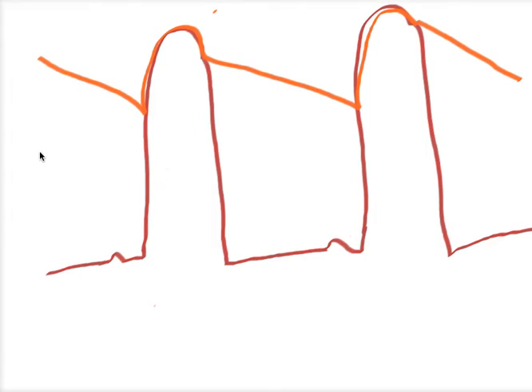This is Dr. Demarchena, again with Aaron Cohen, and we're continuing our discussion of aortic stenosis. In the previous video, we looked at the normal pressure tracings. Let's remember that S1 occurs about right here, and S2 occurs right at the aortic valve closure. Remember, there's an A2 and a P2, but right now we're just looking at S2 as one. Now, we're going to go ahead and take a look at the hemodynamic abnormalities that occur with AS.